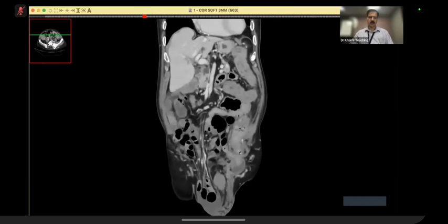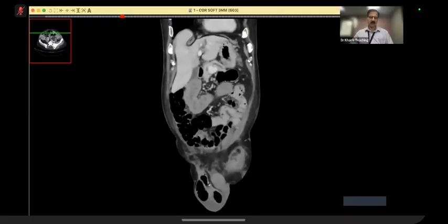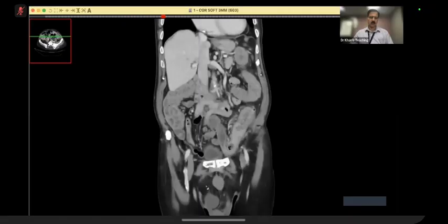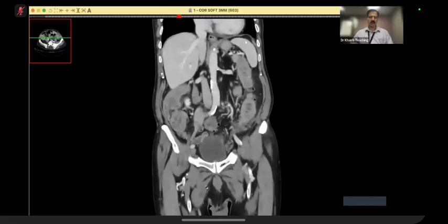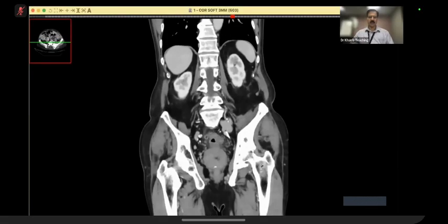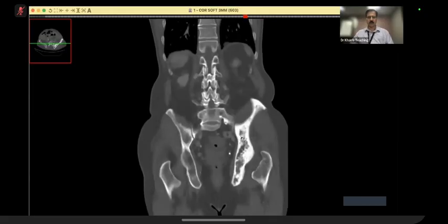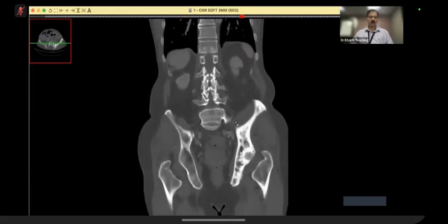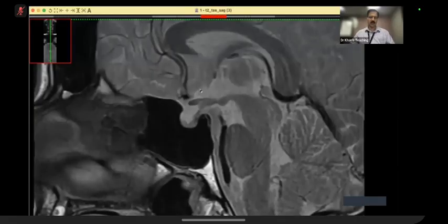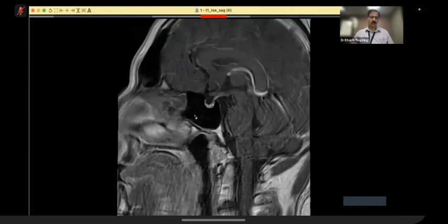You did well, but having said that, it was not causing obstruction. Similarly, the right hernia was also not causing obstruction, but the idea was to pick them up, particularly on the plain film. Pertinent negatives were that there was no sacroiliitis, but look at the Paget's disease. It's classical Paget's disease. So, a case of multiple findings. Well done, candidate. Next candidate is the last candidate of the day.